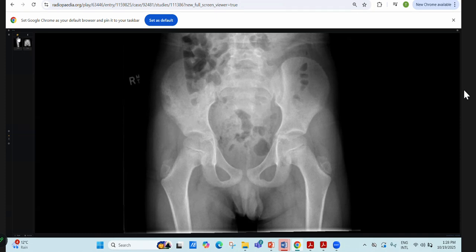Both. Okay. There is some irregular sclerosis over the ilium here, and surrounding soft tissue swelling in a young skeleton. I'm concerned about any aggressive etiology because it has got irregular patchy areas of lucency and sclerosis. It can be Ewing's sarcoma in this young age. I would further like to characterize this abnormality through CT or MRI with contrast.